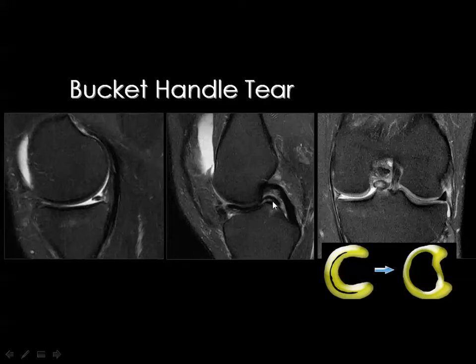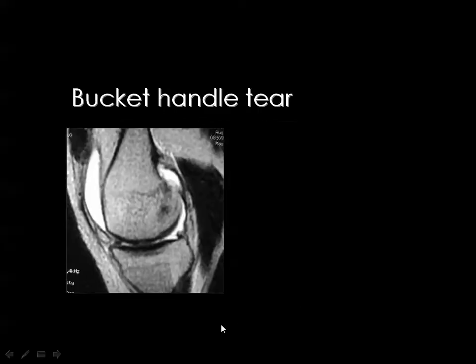Here you can see two PCL or similar to the PCL. This is the PCL and this is the meniscal fragment. Then you know that this is the double PCL sign. Then in the coronal image, you see a meniscal fragment in the periphery, and then the second one is in the intercondylar notch below the posterior cruciate ligament, and this is the anterior cruciate ligament, as you know. Then the first observation to predict the possibility of bucket handle tear is that the posterior horn of the medial meniscus is smaller than usual.